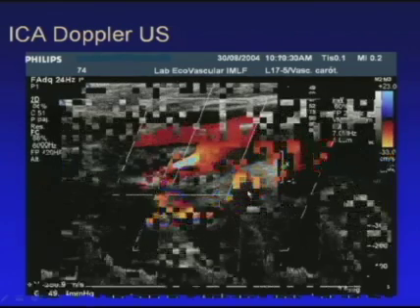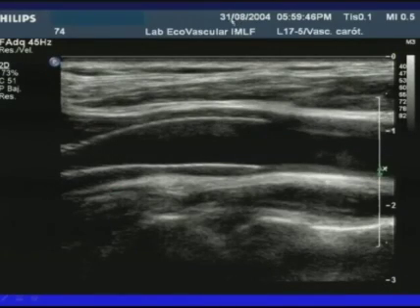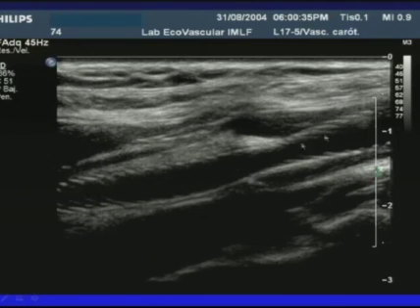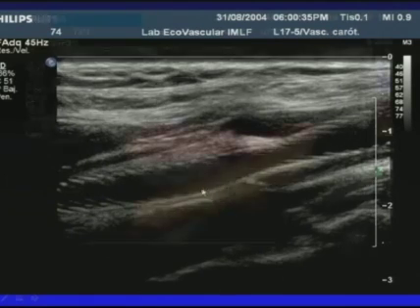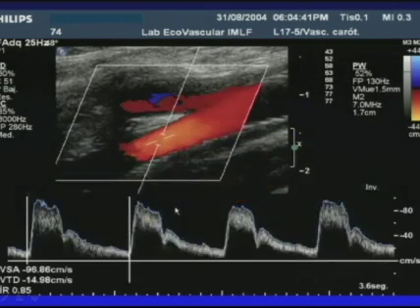Again, the patient with the stenosis I showed you before, 350, day 30, and day 31. The next day, the problem is resolved by placing a stent. This is the posterior or control Doppler, and the velocity previous to the procedure was 350, now is 96 centimeters per second.